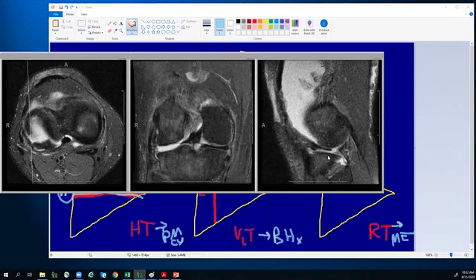On the sagittal projection, I'm seeing the meniscus having two truncated borders, one on the posterior aspect of the medial meniscus body, and one anteriorly on the posterior horn of the medial meniscus. And there's this unusual gap in between these areas of truncation. Yes, so in the chat, people have described the radial tear and the ghost meniscus. Oh, sorry, this was the lateral meniscus.